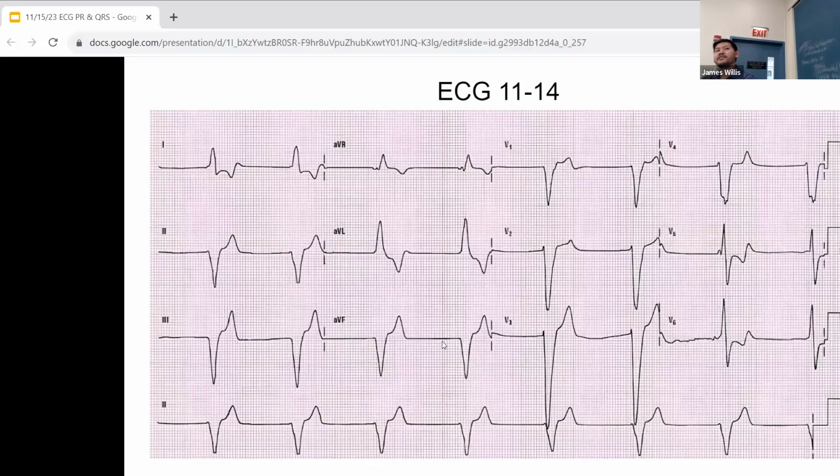The up and down. Yeah. What's the rhythm here? Junctional. Is it? Is it this? Yeah, or is this the wide or narrow? Accelerated junction. But if it's wide, where is it coming from?